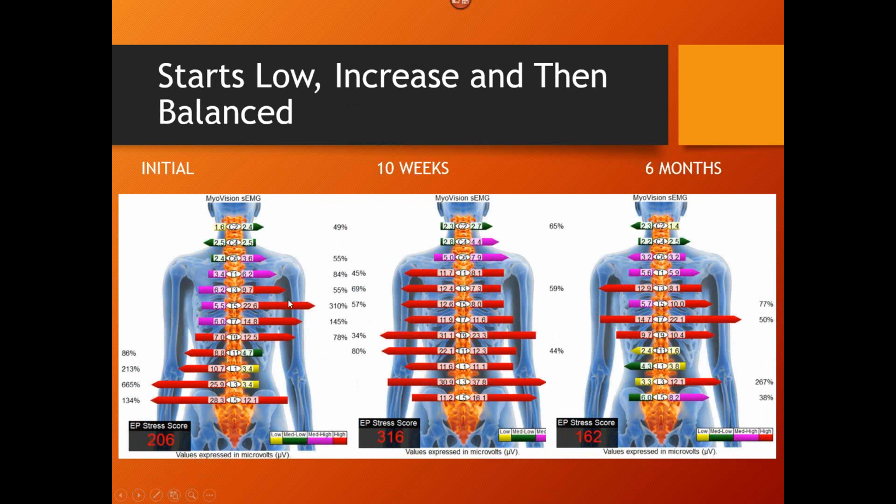Now you'll see the second condition. So that's our first condition, is you'll see a high reading when they come in. That means they're in more of an acute phase. And then you'll see the ones that are actually in a chronic state, and in general, you'll see lower readings. This one isn't quite the chronic that I was looking for, but it's an example of it.